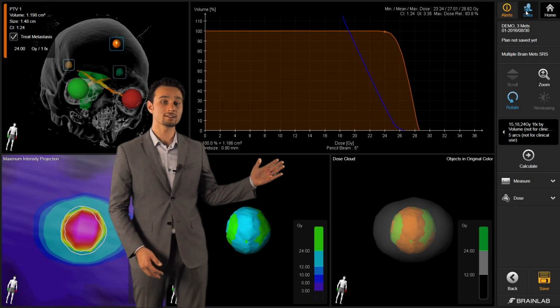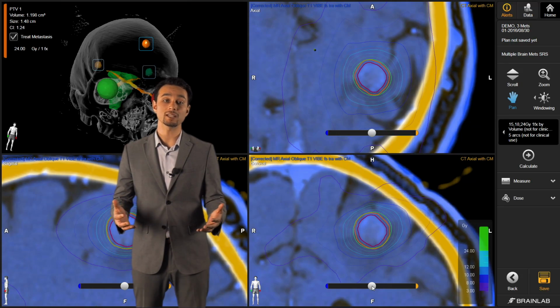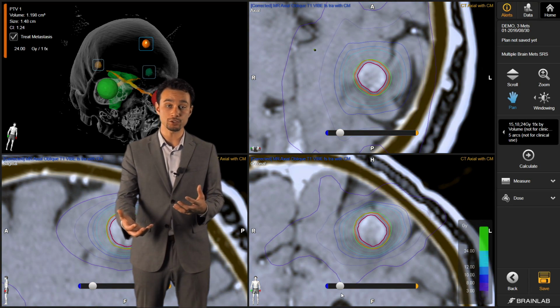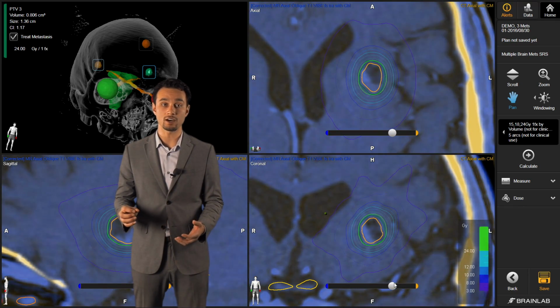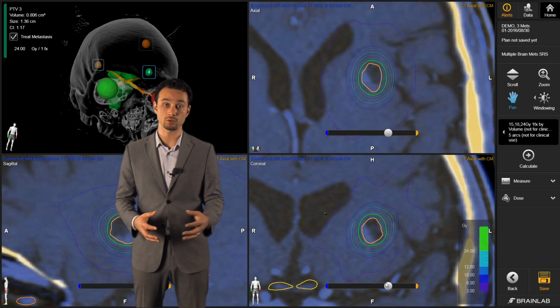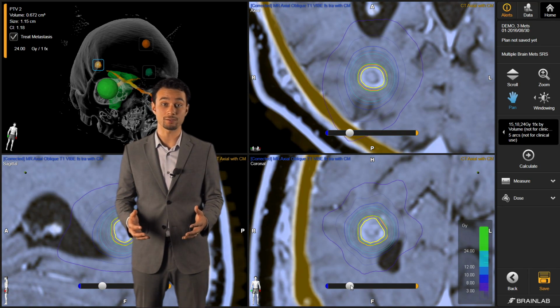If we click on the Data tab, we have one final visualization called Fusion Review. This tab allows you to analyze your tumor edges on multiple data sets in relation to your isodose distributions. Because we're treating a distribution of mets in the brain, you may see slight changes in the positioning of your met versus a data set. Hopefully we've corrected any distortions with the cranial distortion correction element, but if not, this provides a final reviewing step for your physicians.